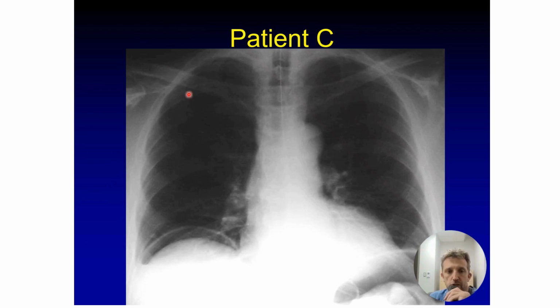Okay, how about this patient? Stones, bones, mass, and gas. They have an enteric tube. It's going in the stomach. That's good. Bones look okay. No mass or mass effect. How about bowel gas? Is there free air?